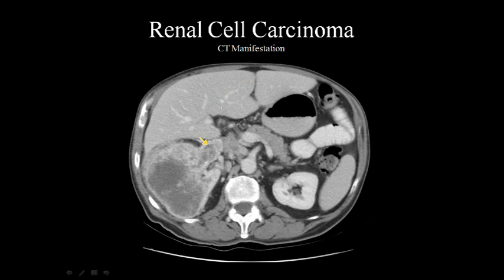So this is more of a confusing image, probably. What looks to be very abnormal is just that, very abnormal. See that we have the liver here, and it's defined by this border. This is the falciform ligament, and then we have the left lobe of the liver here.